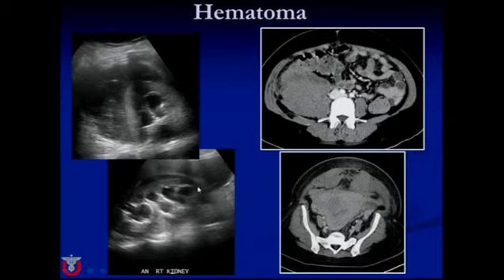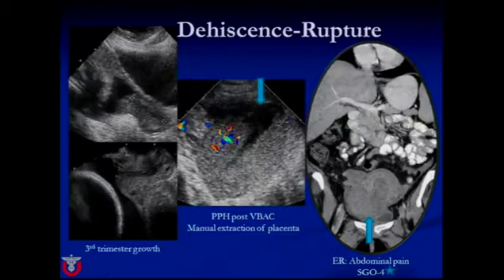And we don't know why this woman developed this large retroperitoneal hematoma, but here is another case, similar appearance, extensive retroperitoneal hemorrhage, and this lady had bilateral rectus sheath hematomas too. So in the patient with acute postpartum sepsis, often you have coagulation problems as well, and if there is a large bleed and a lot of replacement product, that can exacerbate the tendency to bleed.